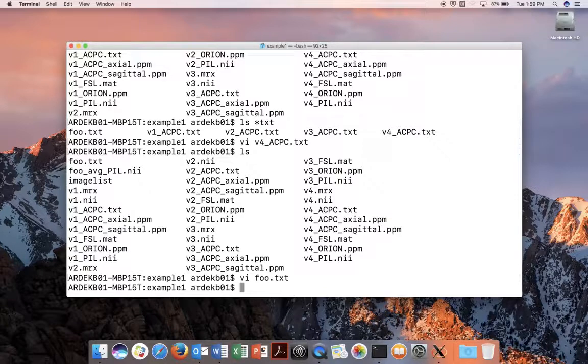So roughly in 1 out of 20 images that are run, the landmark detection fails. Therefore, we have to specify some of the landmarks manually and restart the program. So in the next tutorial, I will go over this procedure.